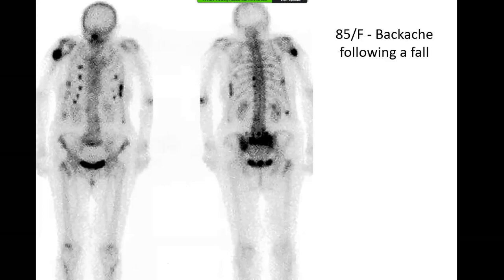Old fractures continue to take uptake until the healing is complete, which means until the osteoblastic repair is going on. And that would again depend upon the degree of immobilization. So for at least 3 to 4 months, you would see some degree of uptake at the site of the fracture. Though as the fracture gets old, the intensity of uptake gradually lessens, you can still see some degree of uptake in a fracture as old as a couple of years sometimes.